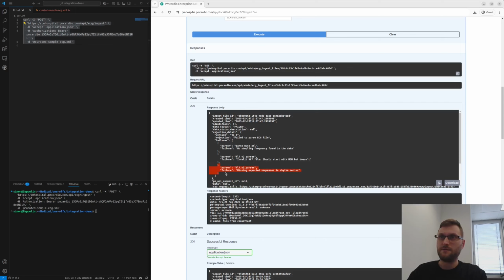It will try to give you a best guess as to what it is that went wrong in the parsing process. You can see that as it was attempting other formats, for example, HL7 version 2, it will inform you of the mistakes and errors in that file, namely the message header is missing as it is usually present in HL7 version 2 files. And GE_muse.xml, for example, is an XML file, so it did manage to parse that, but it could not find the sampling frequency in the place where it would expect it in a GE_muse.xml.